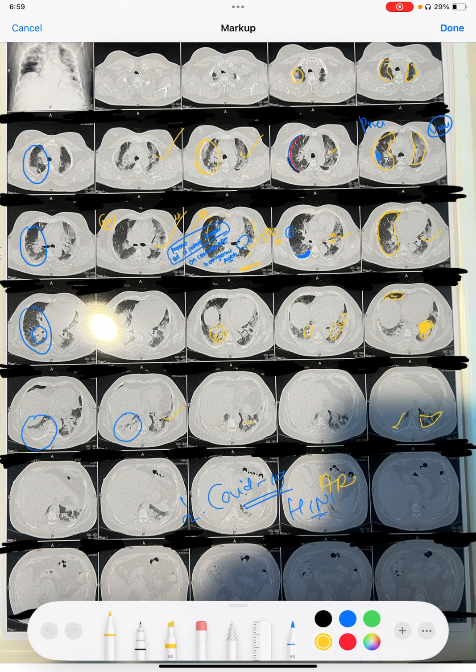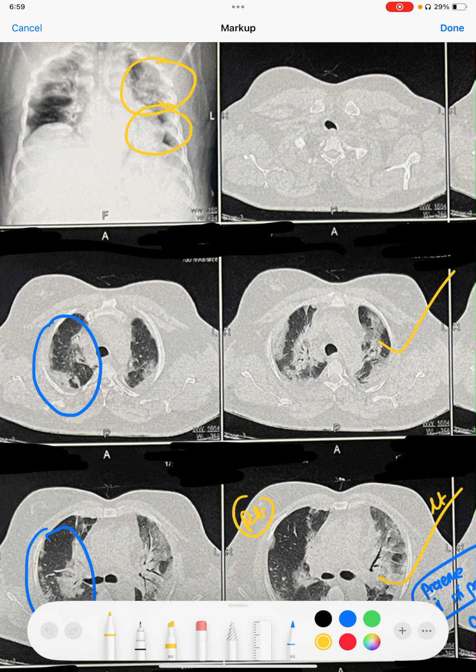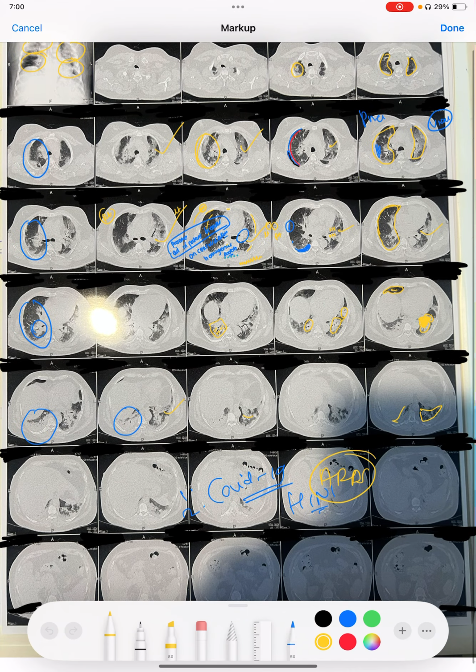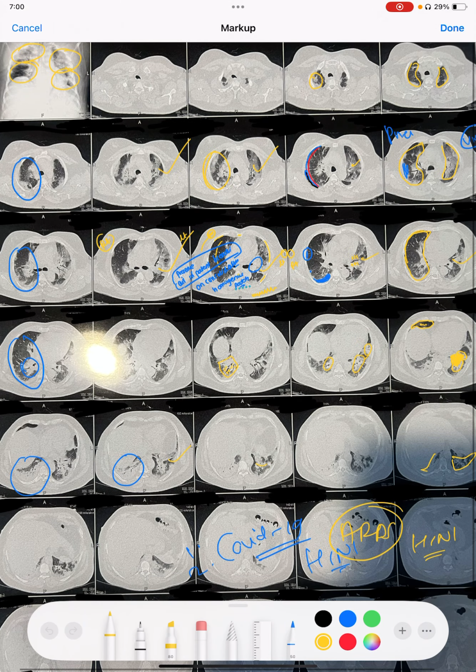So, what is the definition of ARDS? ARDS is significant hypoxemia where out of the four chest lung quadrants, like this, we have this one quadrant, second quadrant, third quadrant, and fourth quadrant. If we have more than three quadrants of lungs involved, along with the hypoxemia definitely, we label it as ARDS. So in here, all the lung quadrants are involved. So this is an H1N1 multilobar pneumonia with ARDS, which is very easily diagnosable by the presence of subpleural patchy consolidation with extensive bilateral lung involvement.